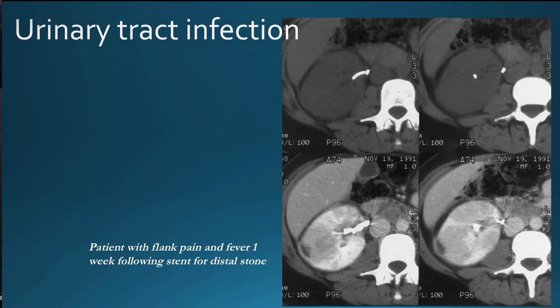So in a typical non-contrast CT, be careful to look for potential signs of more significant infection, including perinephric stranding, or in this case, the upper left-hand image where there's a hint of subcapsular fluid, and then you may recommend a post-contrast study.